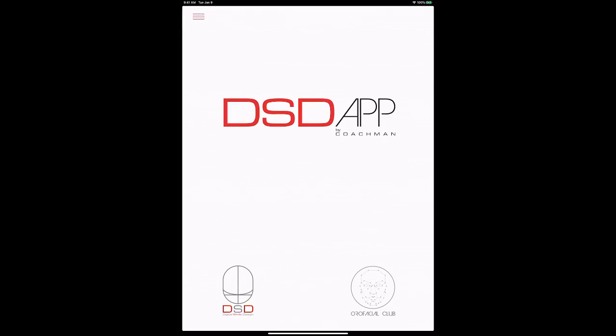And today I'm gonna show you a feature that we have, and we're gonna discuss smile simulations, and discuss the power of the smile donators. This feature that we have integrated not only in our smile simulation but also in the 3D smile design is very important, because the way we design smiles and the way we see smiles in relationship with the face is completely different.